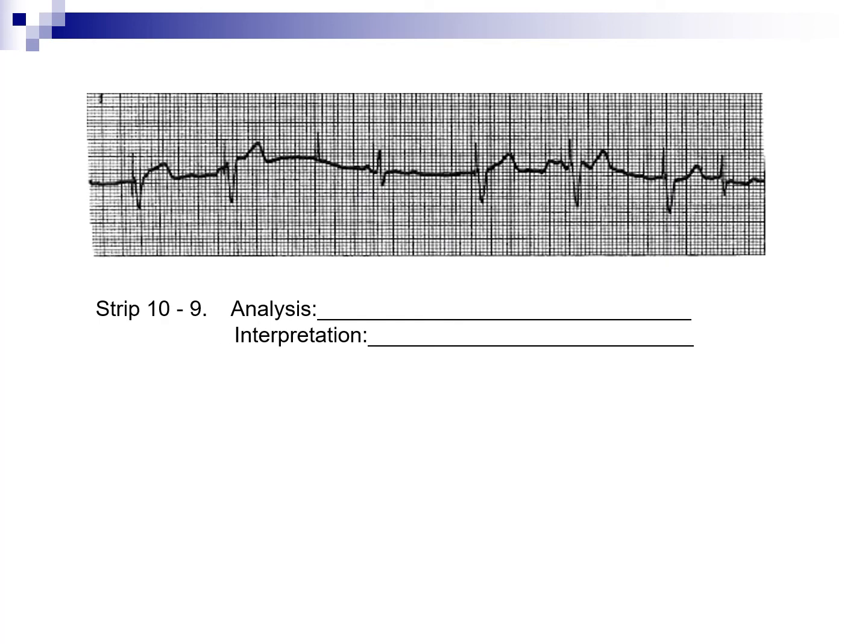So in 10.9, looking at this, we have ventricular pacing, pacer spike, QRS, and then you have a spike, but no QRS. Then the patient's own beat came in. Then you have again a spike QRS, and a spike QRS, and a spike QRS, and then the patient's beat came in early, which is normal. But we do have, I'm going to get rid of some of this stuff, a failure to capture. So in this pacer spike, it failed to capture after the second complex. So this is failure to capture.